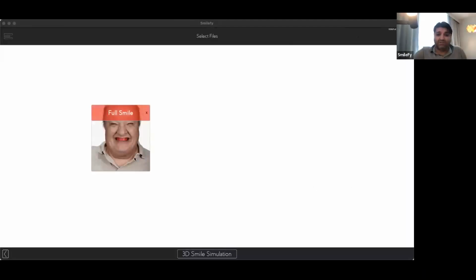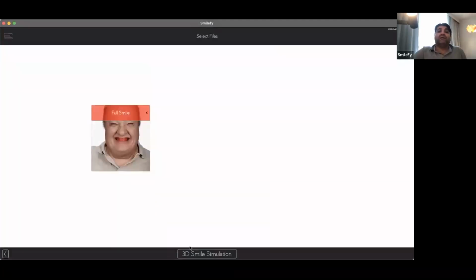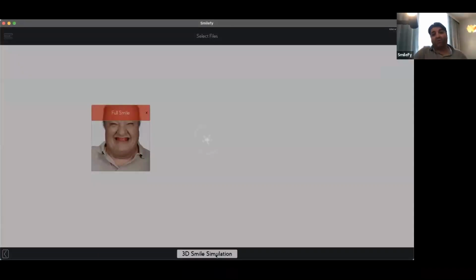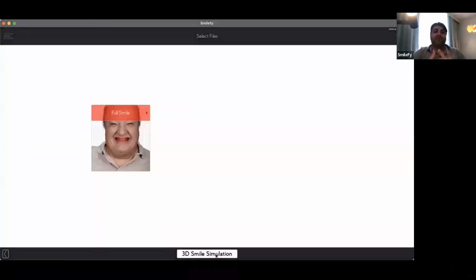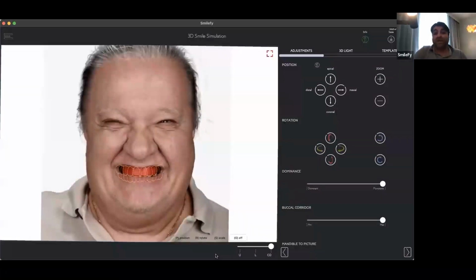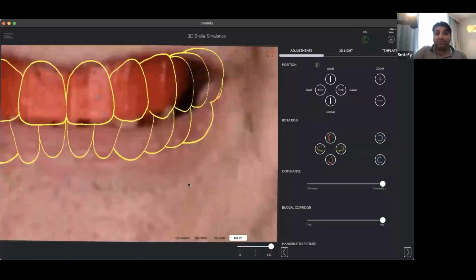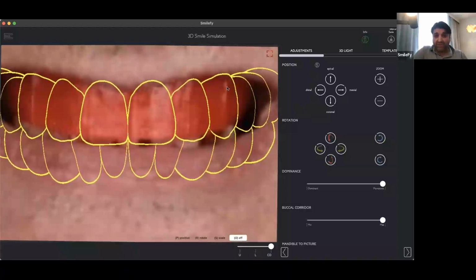the picture with the wax ring, right? So we have the wax ring. How do we discuss with our patient what templates, what form of the teeth do we want to produce in our full arch implant bridge or removable denture? With the wax ring is actually easy. We know the incisal edge, we know the occlusal plane, we know the edges of the canines.